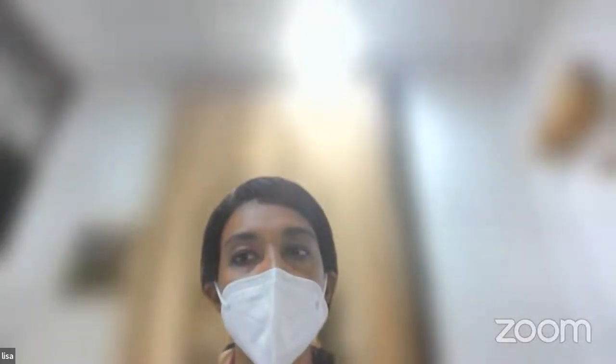How far from the center of the fovea? You leave a little central area. What is the minimum area you like to leave? But incidentally, here it is much more than that. But how much would you like to leave? 500 microns away. Yes, 500 is the absolute limit. In this case, incidentally, I think 1 disc diameter was left. Okay.